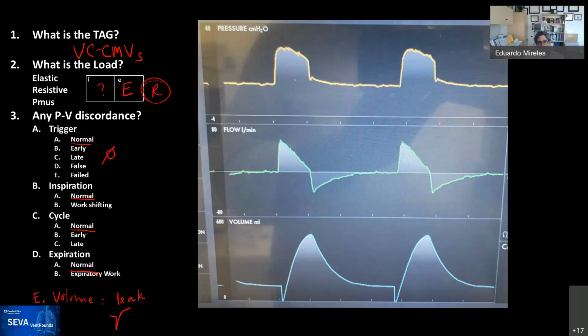All righty. So there's a lot of truth in your words, and so let's do some comments for those that are wondering how you came to that conclusion. I purposefully, intentionally cut the tag of the mode on the top, and I cut almost everything, although I left a little bit of a hint there, but it doesn't really matter.